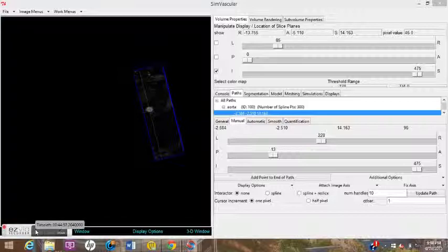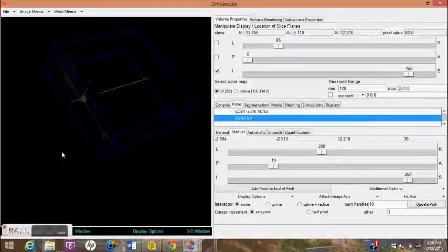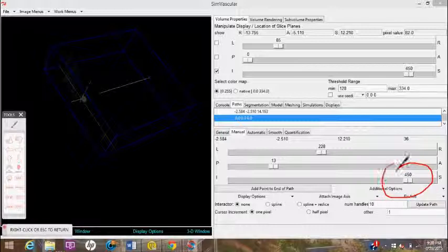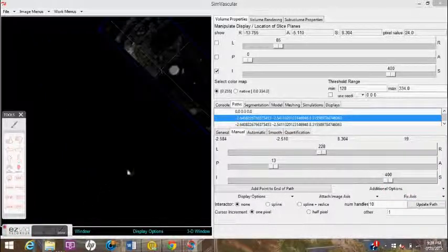And then I kind of messed up a little bit here, but it works out. I added the wrong point. I had a 0, 0, 0, because I forgot to click the T, or I hit it in the wrong spot. But I moved it down to 450, so we're moving the image up. That image axis is attached to that inferior superior, and so as we move the inferior superior, the image is moving with it. And so that 0, 0, 0 was not what I wanted.